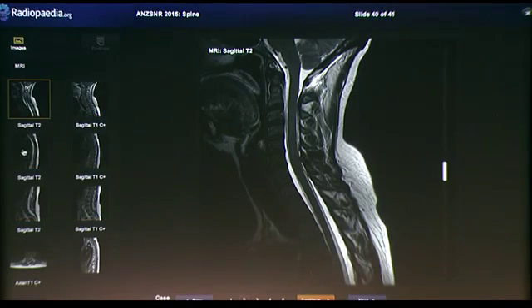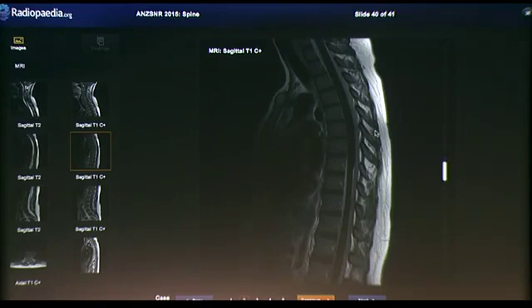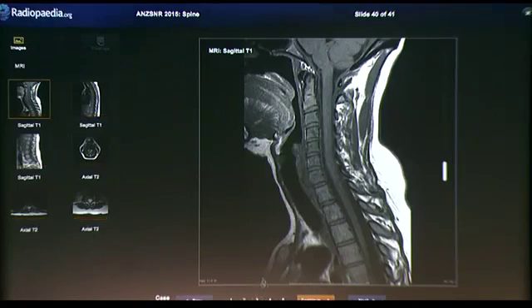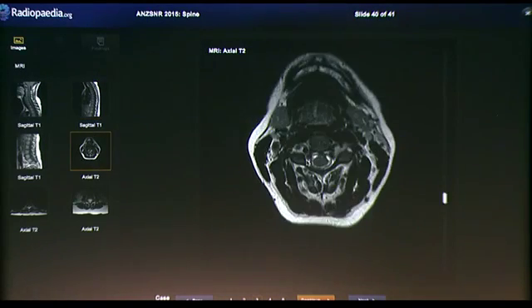And so what we have here is a delayed post-contrast MRI, showing presumably something contrast enhancing in the extradural space. So this patient was returned later on for repeat T1 imaging, which shows that indeed those collections are a CSF signal, and that increased signal in the T1 previously had been enhancement.